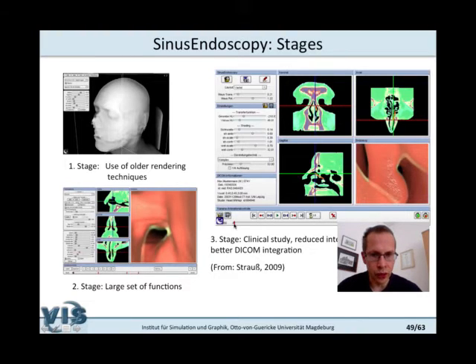Yeah, and here you see that we are at the beginning of such a pre-recorded video. The layout can be changed as I briefly commented, and you can make screenshots for documentation. That's quite important, and you can annotate the endoscopic visualizations in order to specify some landmarks or to define where you have to cut into the wall of a cavity, which you could also use to discuss with a colleague.